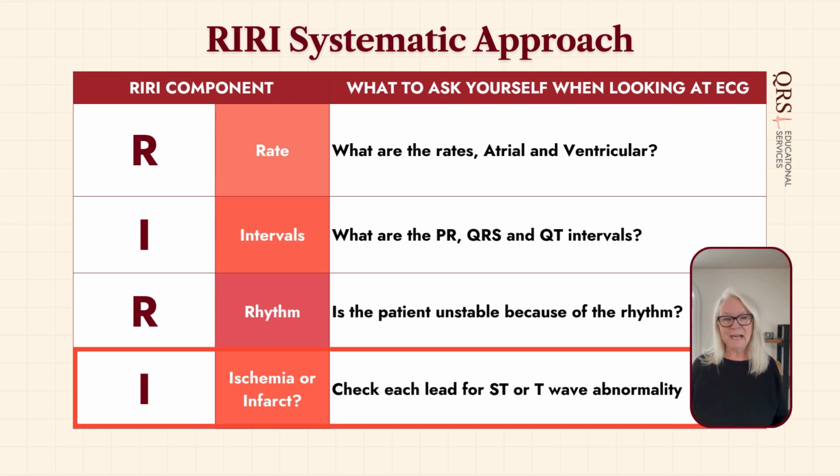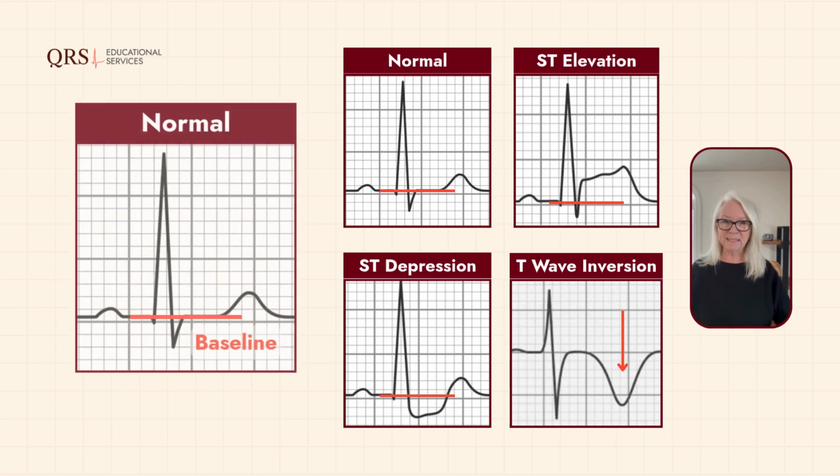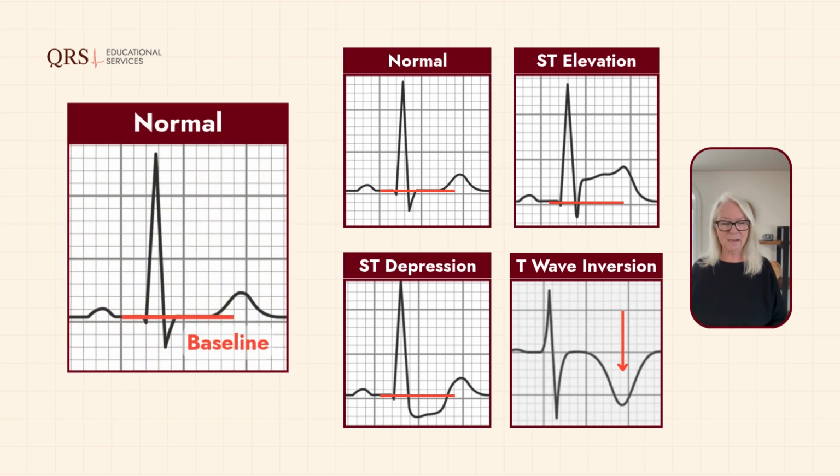The final I is going to take most of the time. You need to look at each lead and you're looking to see if the ST and the T waves are at baseline and the T waves are upright. That's normal in every lead.